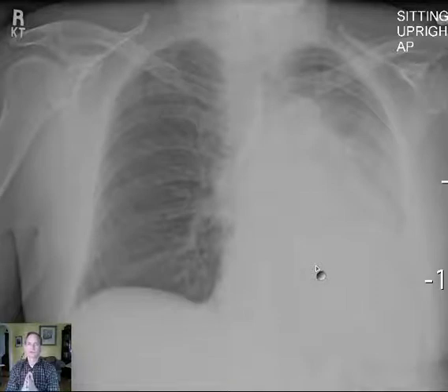What do we do next? What study? You've made the findings, you've described them. At this point, when you start thinking about what study is next, it's a good time to think, what might this abnormality be? Because possibly what you suspect it might be could affect what study you decide to do next. What do you think it might be?